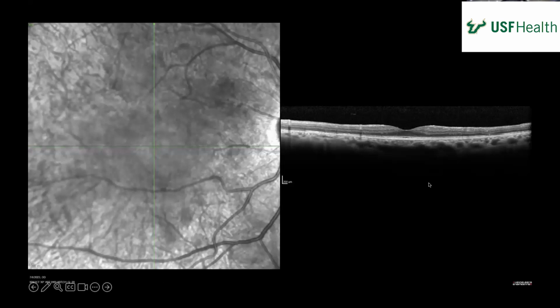It looks like there are some hyperreflective foci throughout the middle and inner retina. What are those? Most of those are just pigment. That one, not that one, the other one. One's the shadow. These ones right over here. Those are vessels. We're both driving the point.